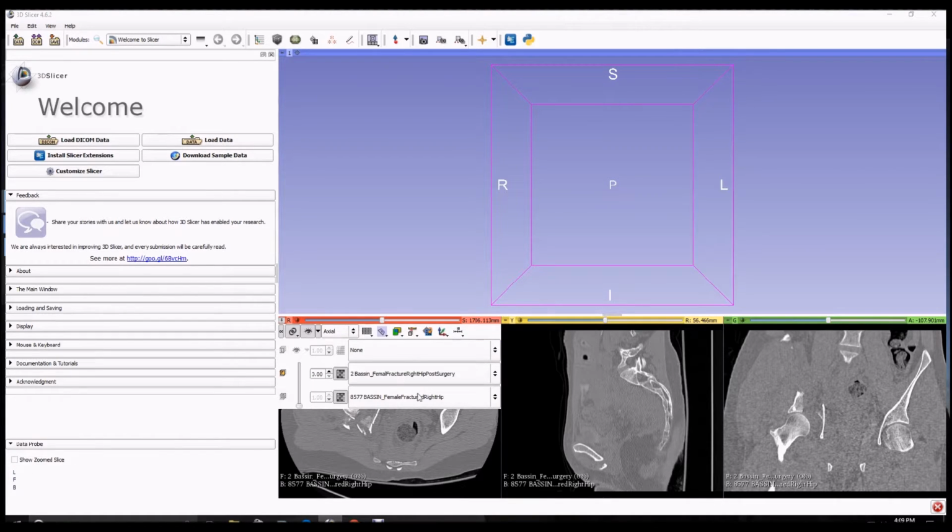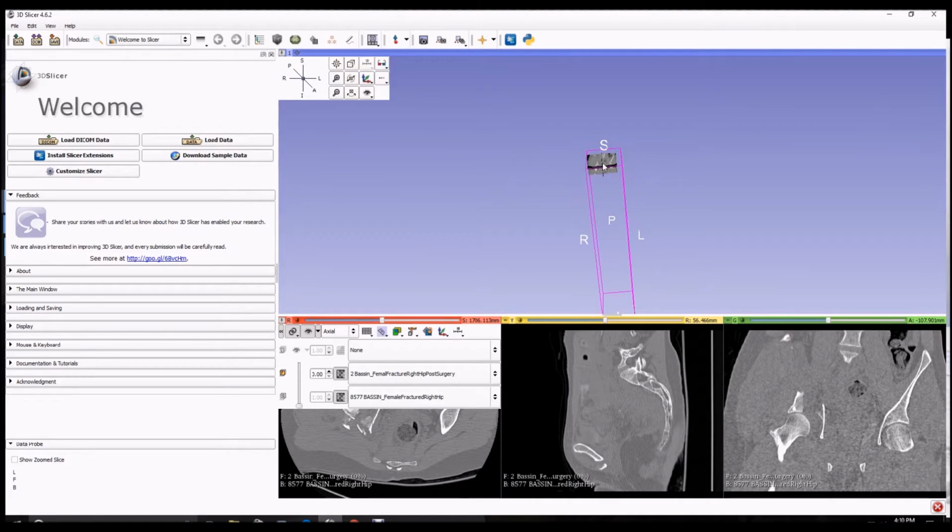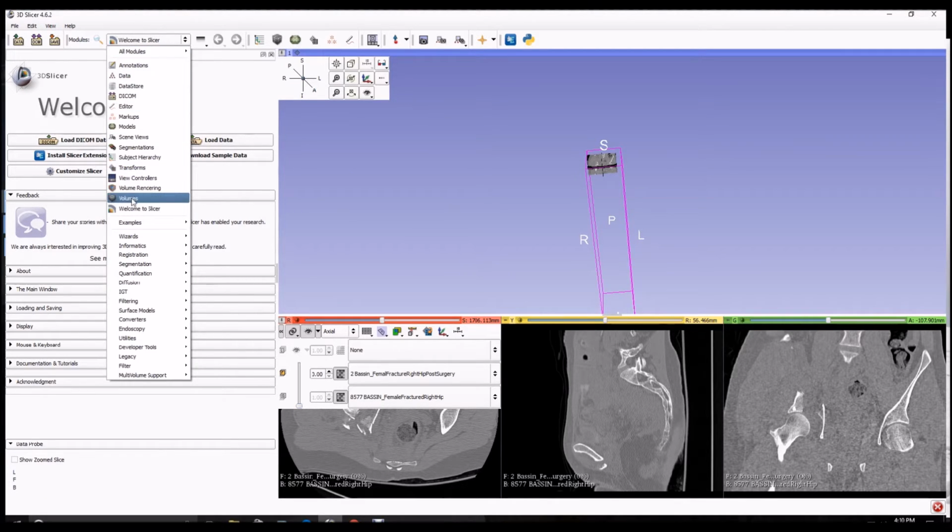And you can see them here. So right now when I load them in, if I show them here, you can see one of them up here, and then if I was to scroll to this one, you'd actually see it. It doesn't show up because I'm not zoomed out far enough. So the simplest thing to do is to center both volumes.